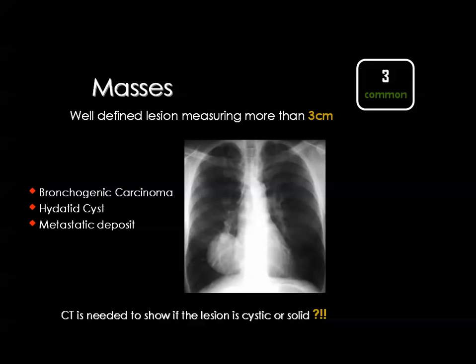If there is any nodule seen once per year in the clinical practice, you consider it common, and you put it into the differential diagnosis, then you have seven possibilities, and you started to put some criteria for the seventh lesion to be differentiated from the rest of the six pathologies.